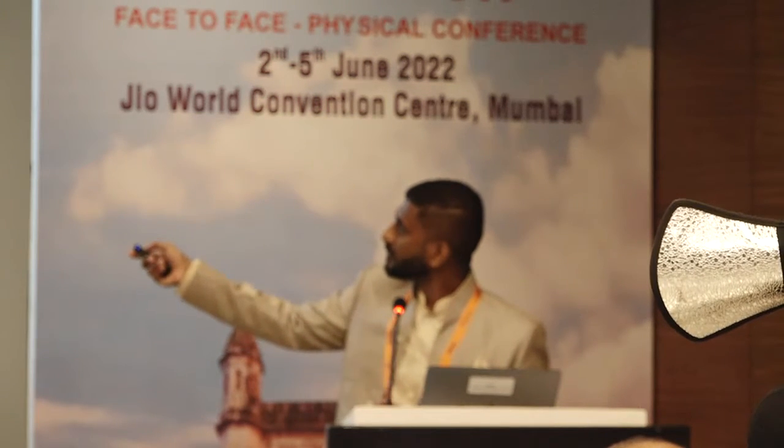So this is a glaucoma module premium edition, as Spectralis would like to label it. I'm going to take you through these boxes here, where it's more of an anatomical orientation as to how RPE is over BM and the BM is over choroid and the choroid is over sclera. So this GMP actually has an anatomical positioning system, because today we are more dependent on GPS. It's still debatable, as we had quite a good debate now.